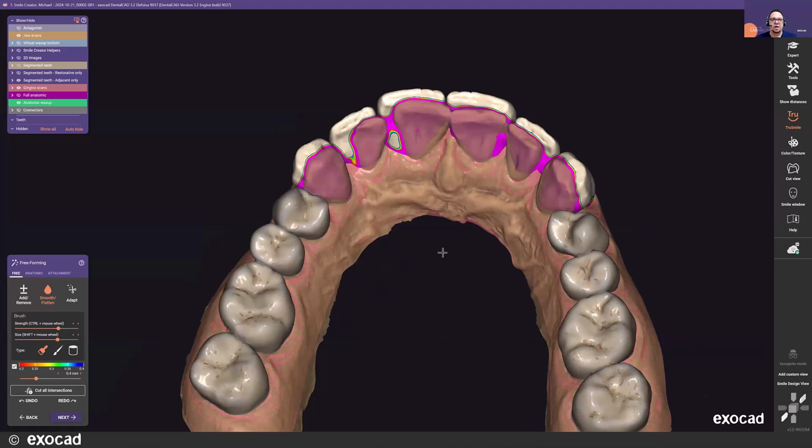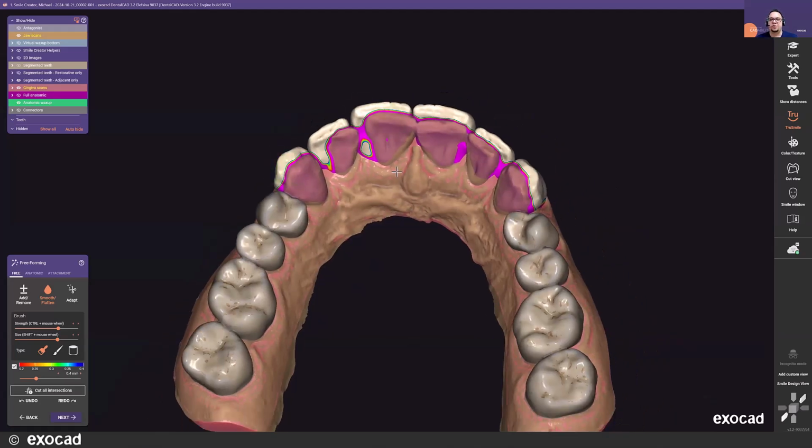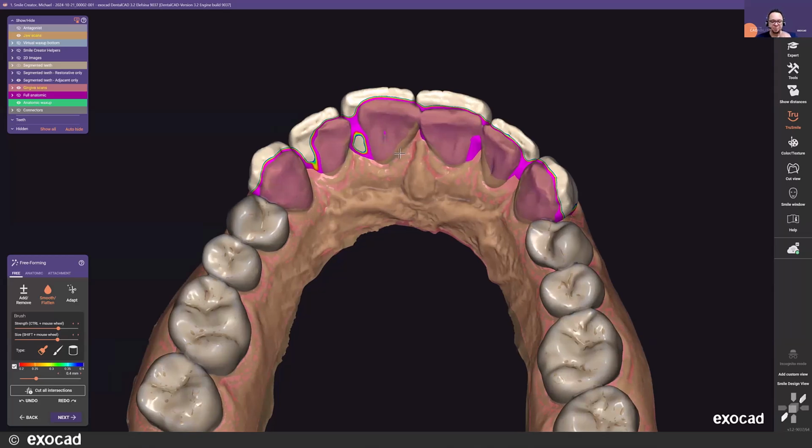When you use mockup or ModelCreator, tooth model files are going to be exported to the project folder automatically. And the good thing about that, it's exporting the whole tooth library that you place, all the scaling, position changes you made, shape adjustments. So this patient isn't prepped yet. We're trying to get their buy-in for the procedure. Once they accept that, and then the doctor moves forward by prepping the patient, you then have that design that the patient loved and signed off on.